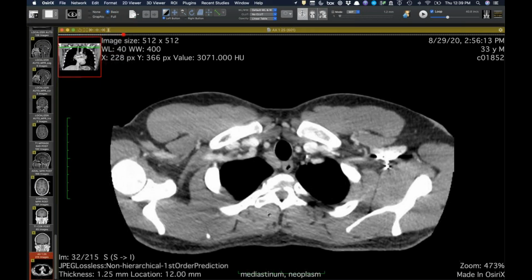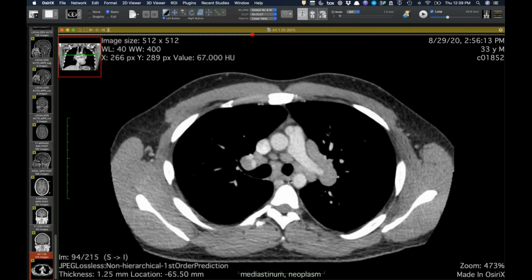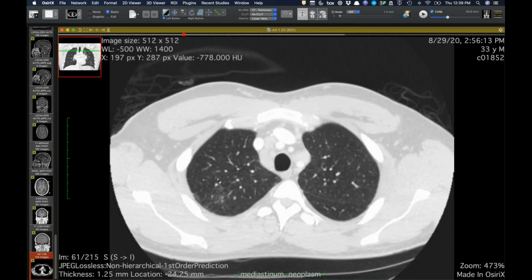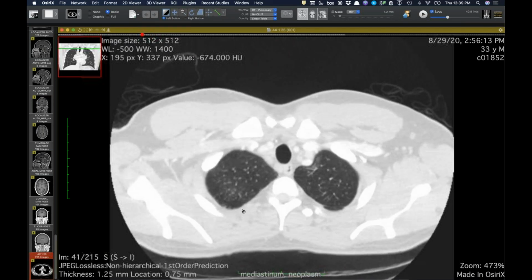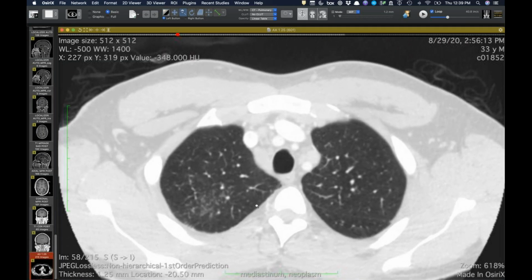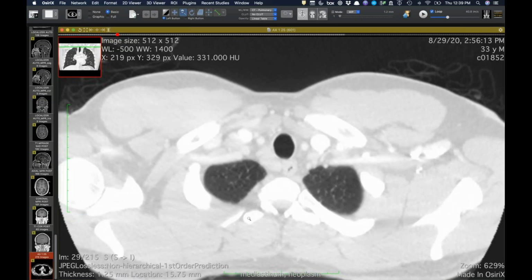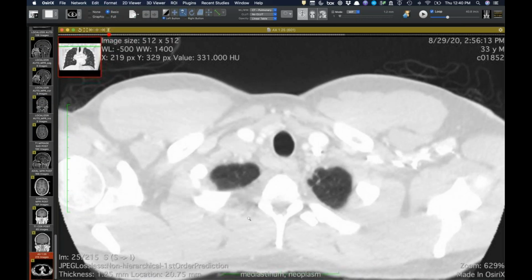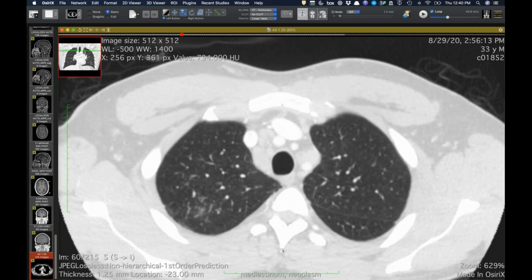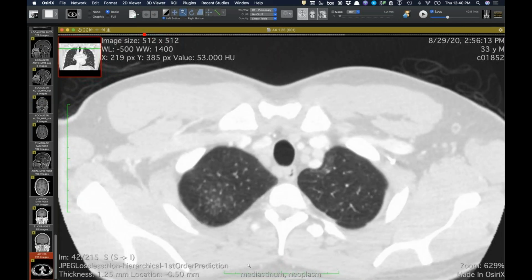And of course, I took a quick look at this and noticed these are very discrete lymph nodes. They're uniform in their enhancement and typical distribution. And then you look at the lungs, and there are a few tiny little micronodules. So I was the first one to bring up sarcoid as a diagnosis and showed this again to the neuroradiologist, asking, can sarcoid give you this kind of intramedullary lesion? I vaguely remember that from board studying, but it's been a while. And one of our senior neuroradiologists said absolutely.